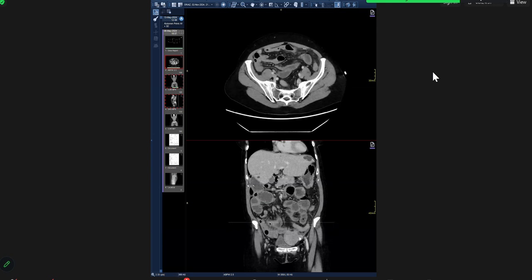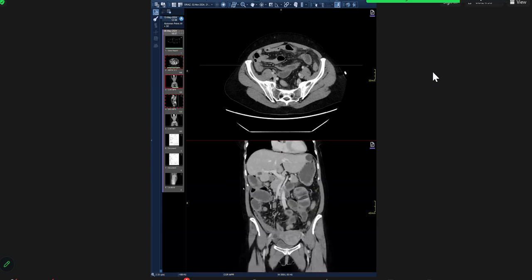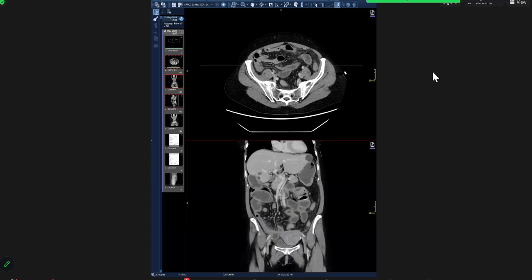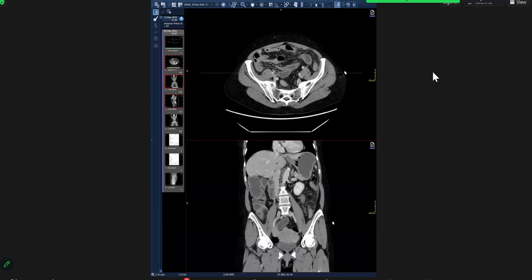So can you summarize? I can just see the distended bowel. I can see the small bowel obstruction is there, but I cannot make out the reason or the lead point. What is the reason for this small bowel obstruction?